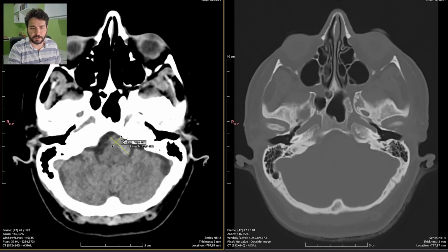So this tumor is anterior and to the left side of such anatomical structure, and it's also extra-axial. It is outside the brain, in the subarachnoid space, occupying partially a posterior fossa cistern. So let's describe that.